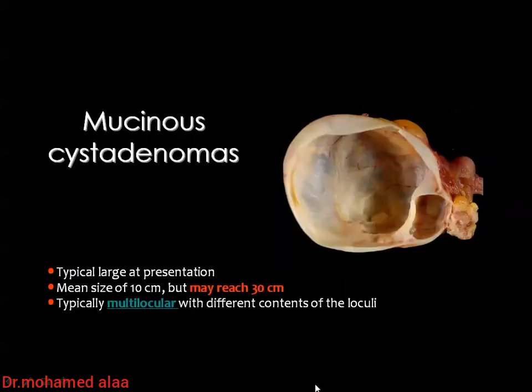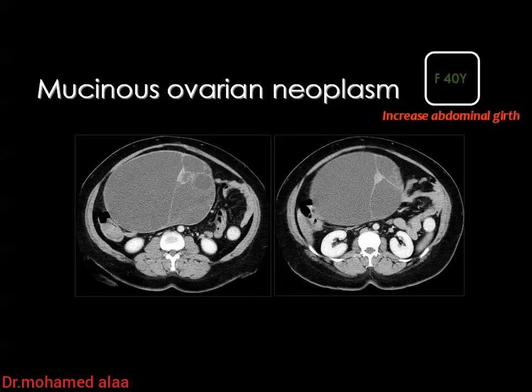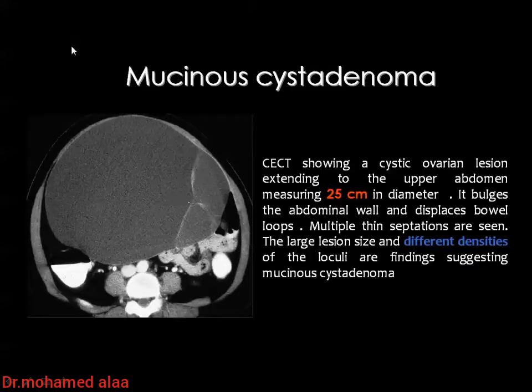Then the mucinous cystadenoma contains septations, and here you get an example. A huge cyst also, and you can see internal septations, but very importantly, you do not see solid component. Solid component means that you are dealing with a malignant pathology. But only here you can see cystic septations, and you may also see some calcium. And this is a good example of a mucinous cystadenoma, and you can see the septations and you don't see the mural nodules.